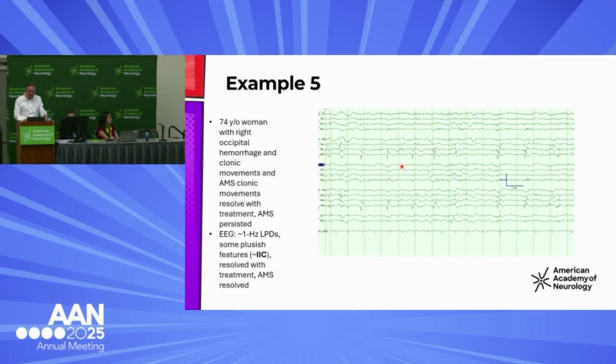And here's one that's really close to that border, about 1 hertz, that has some plus features associated with it. Maybe, I don't know. That, I think, is the IIC of the IIC.